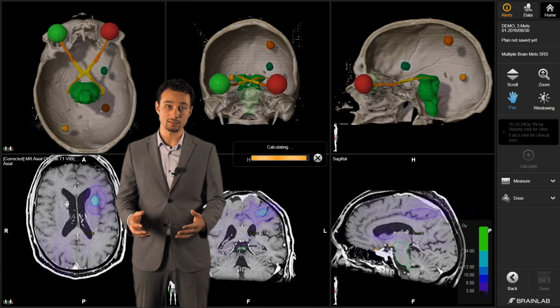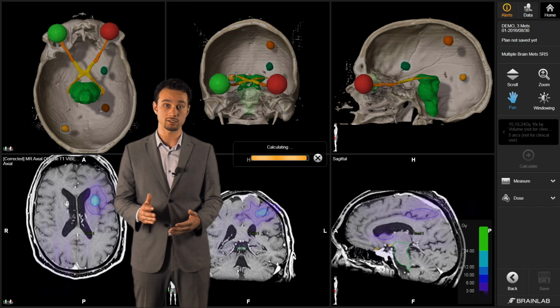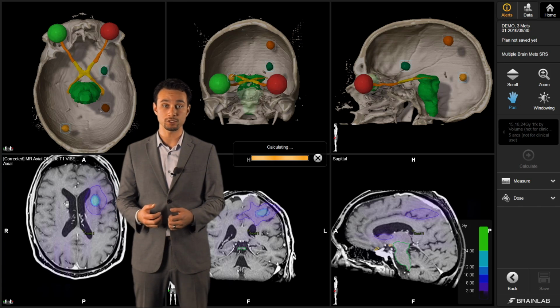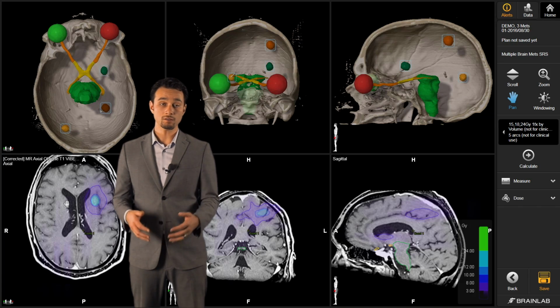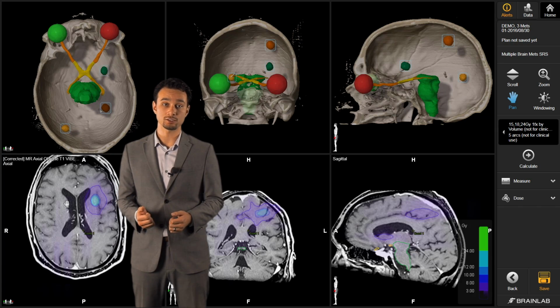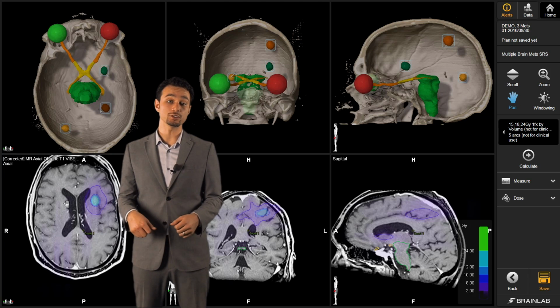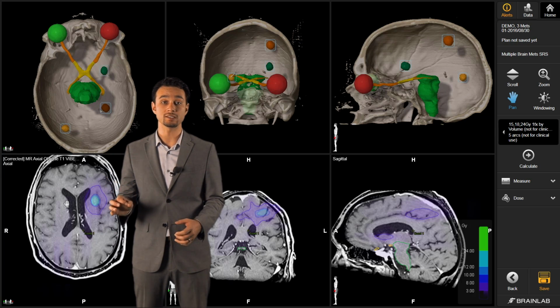Once it defines this, then we'd go into figuring out what the arc weighting is going to be to most efficiently deliver your prescription doses and result in the best conformity indices possible. Novel to this software, we use the conformity index as an active penalizer to the objective function. As a result, you can expect to see the dose heterogeneity within the tumors to be slightly higher.